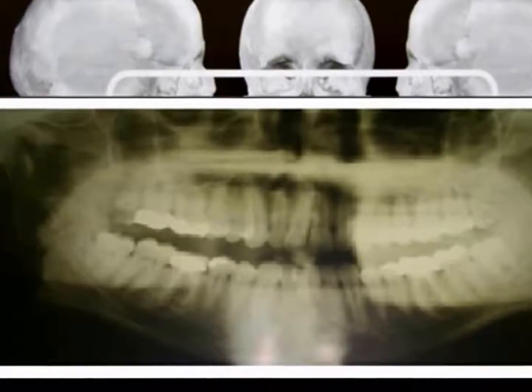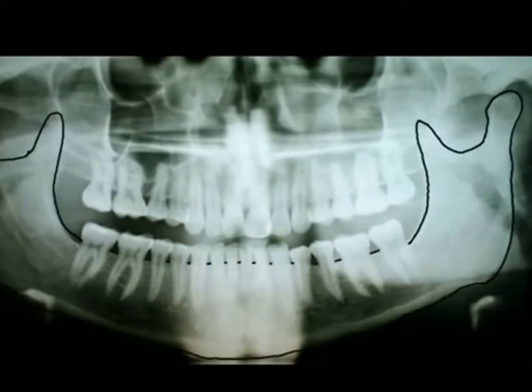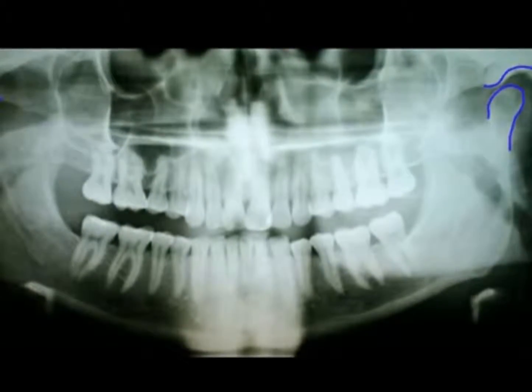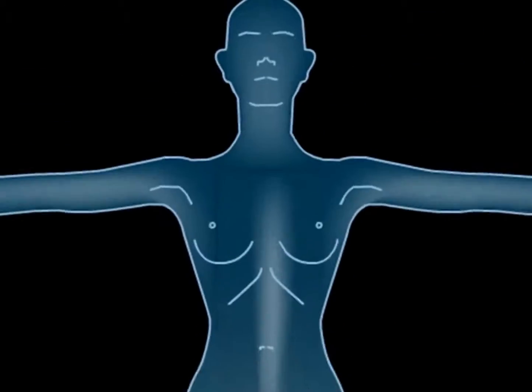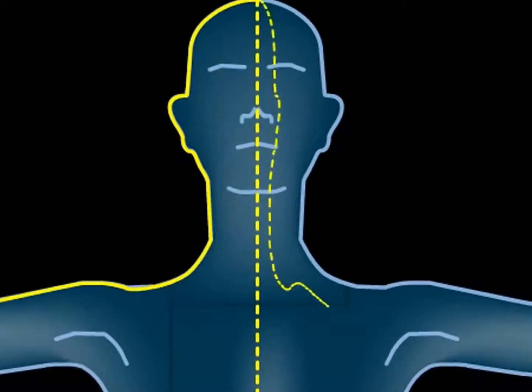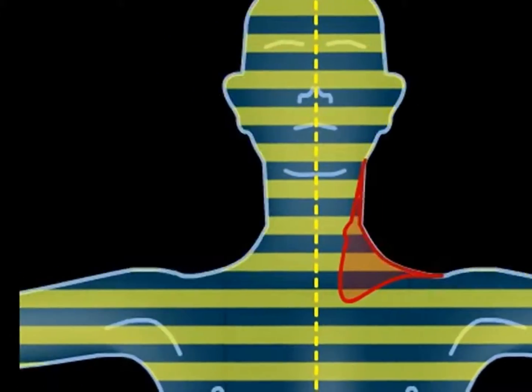Your face looks rolled out on the picture. You can easily recognize the lower jaw and the jaw joints, which are round and regularly spaced when healthy, and there is also a clear joint cleft. Medical experts generally consider symmetrically occurring changes on both sides as benevolent. So if the change in the cleft or the form are symmetric, then this can be considered a variation within the norm, not a pathological change.